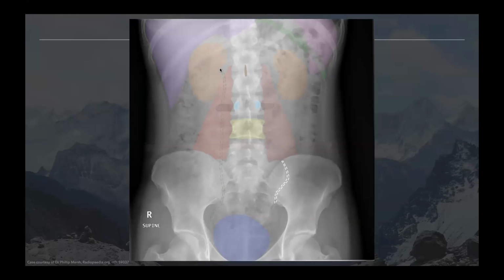And when you're on your D part, your densities, you'll be looking for things like gallstones and renal stones. And when you're looking for renal calculi, you should follow the course of the ureter. And a good marker is the edge of the transverse processes of the lumbar vertebrae. So if you follow that down, you'll be pretty much on the line of the ureter.